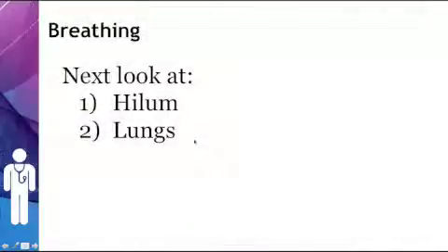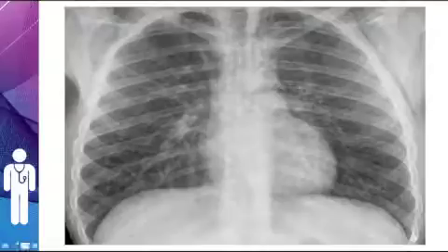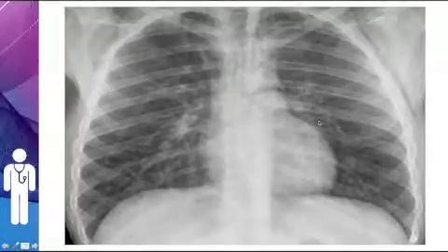You need to look at the hilum as well. We're going back to the last film. You've got the pneumomediastinum here and here, but you've also got the hilum here.